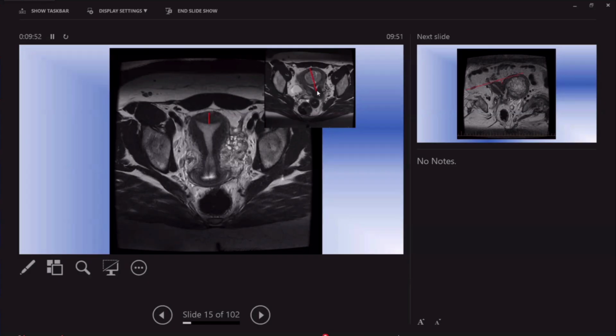In this case, within the septum you have a well-defined intermediate signal intensity myometrial lesion. This is something else to evaluate, and you have a differential for that, but most likely it is an intramural uterine fibroid within the septum. But our question now: am I dealing with a septate uterus? Yes, I am. Then your next step is to decide whether I am dealing with a complete septate uterus or a partial septate uterus. What is the difference between the two?